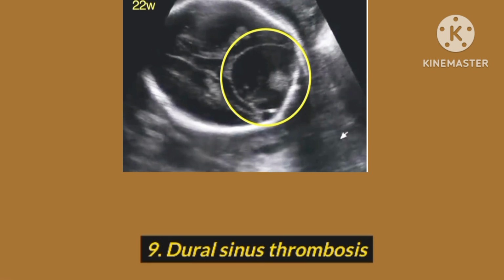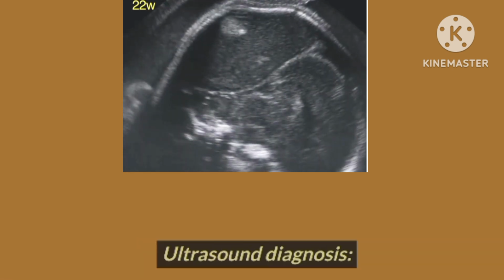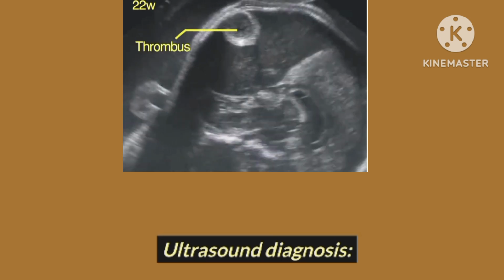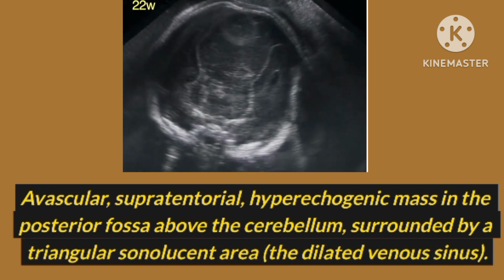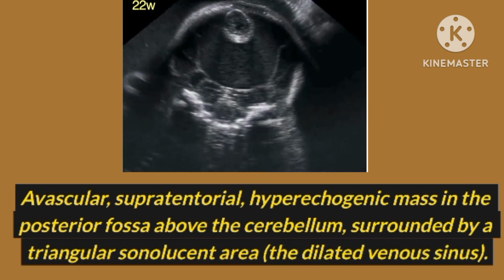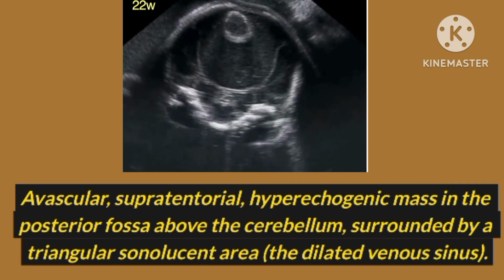Number 9. Dural sinus thrombosis. Ultrasound diagnosis. Avascular, supratentorial, hyperechogenic mass in the posterior fossa above the cerebellum, surrounded by a triangular sonolucent area, the dilated venous sinus.